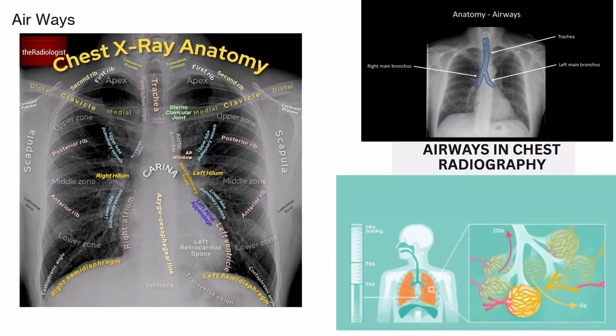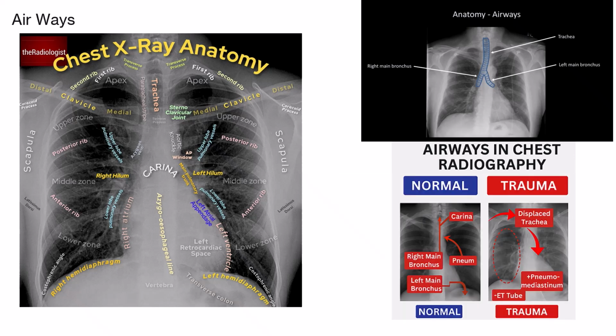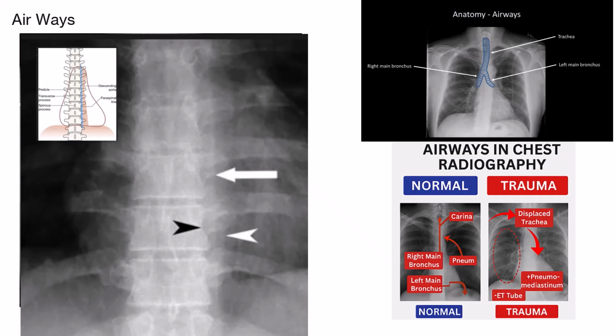If we take a look at the bronchial tree, visible if surrounded by air bronchograms, it helps us identify contusions or collapse. And finally, we look at the paratracheal stripe, which is a thin, soft tissue interface adjacent to the trachea. Thickening or displacement may indicate hematoma or mass, or if around the T-spine area, a T-spine fracture.